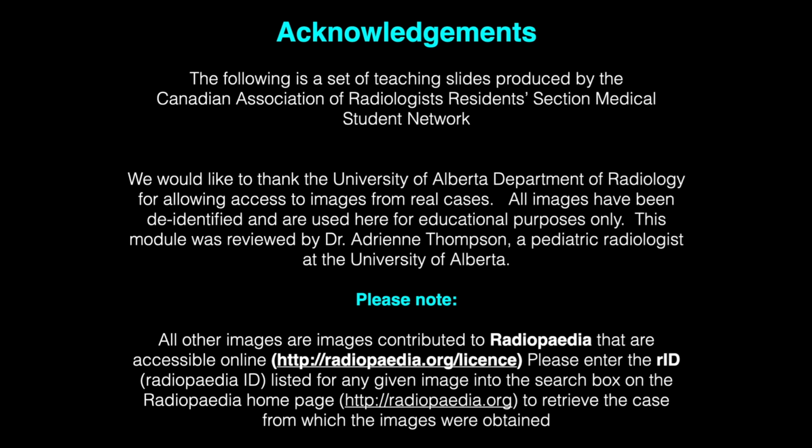After watching this video, the learner should be able to, number 1, list the ossification centers in the pediatric elbow. Number 2, use the CRITOE mnemonic to recall the order in which ossification centers appear. Number 3, use knowledge of ossification centers in the pediatric elbow to recognize avulsion fractures in the pediatric elbow. So now, let's look at ossification centers of the elbow.